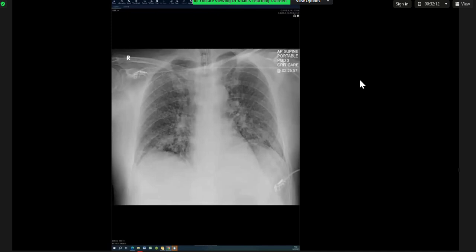And I would say, immunocompromised. So this could represent a fungal infection, so Pneumocystis pneumonia. Sorry. This could be miliary tuberculosis in an immunocompromised patient. Mm-hmm. What do you want to do next?